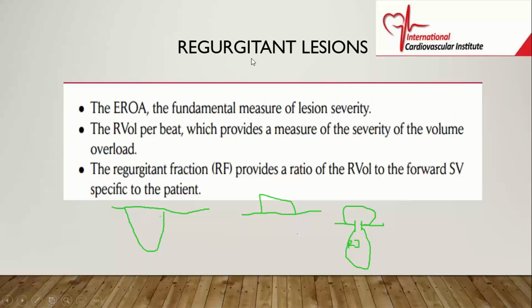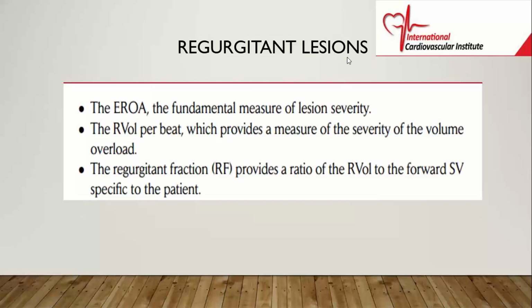There are a few methods using Doppler to quantitate valvular regurgitation, and let's look at that. When we look at a regurgitant lesion, there are a number of things that we can assess. We can assess the EROA, which is the effective regurgitant orifice area.